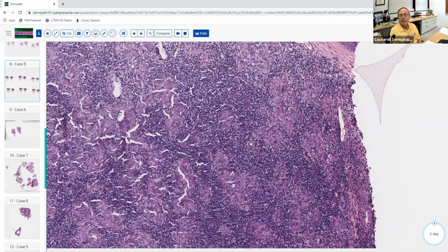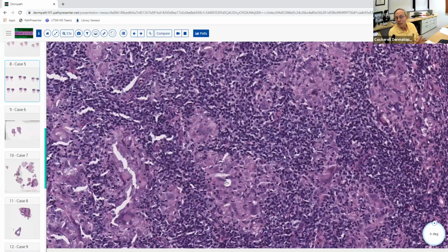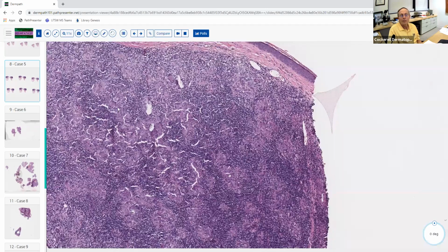So the interesting thing about this case is that the inflammation almost has a sarcoidal pattern, which you can see more commonly with things like silica. If glass gets implanted in somebody's skin, that tends to form a sarcoidal granulomatous reaction, usually with some lymphocytes. It's not classically sarcoid, but it can give you a sarcoidal granulomatous dermatitis with usually more lymphocytes. That helps you distinguish it from sarcoid. And if you can see the material, by polarizing it or like this, where you can see it in the tissue, then you have the diagnosis. So there are some subtle differences between this and sarcoidosis itself.